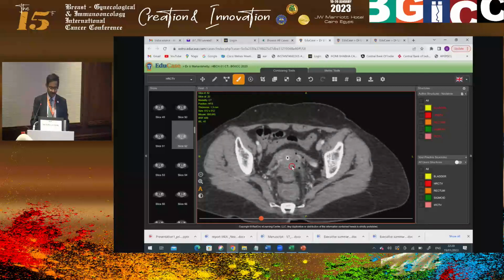Okay, so now let's say, for example, in this region, it's very clear to me, cervix is here, anteriorly, going here, and then some extent here. Now your NMDs come into play here. Measure tool. This one? Yeah. It is 2.1 and my NMD was 2.5. Even if you're 2.5 or 2.8, doesn't matter. Few millimeters here and there, it doesn't matter because you're guessing. Okay, it is a guesstimate.